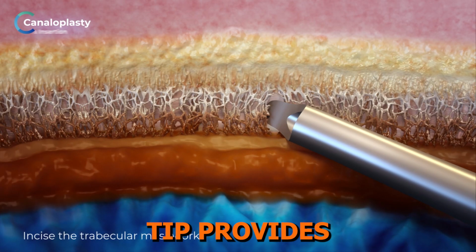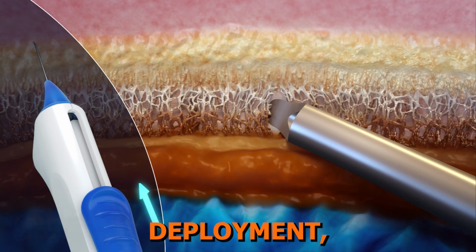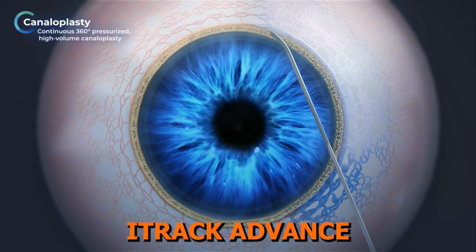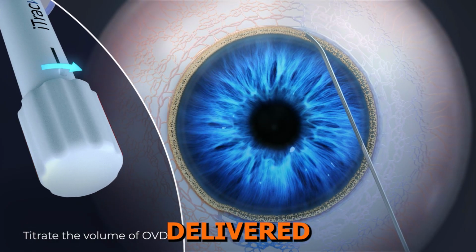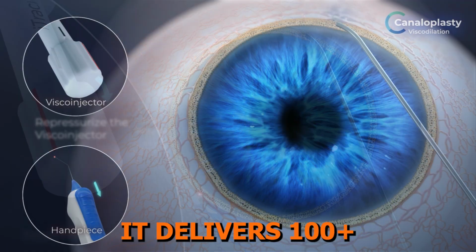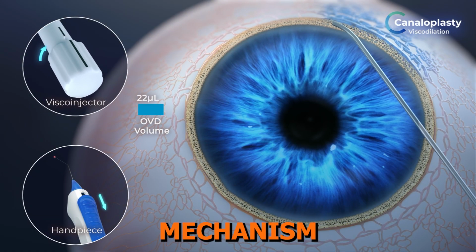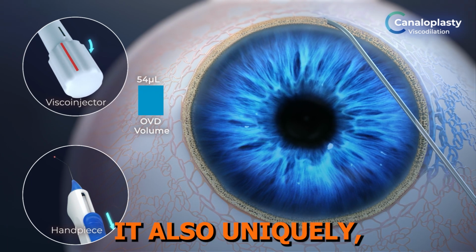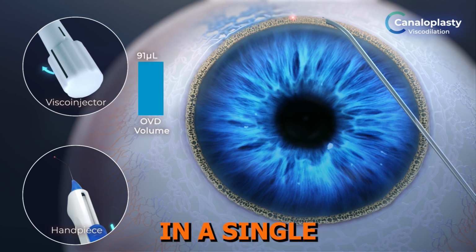The spatulated tip provides stability and precision, and the handheld injector simplifies deployment, eliminating the need for forceps to insert the catheter. iTrack Advance is the only device that can titrate the volume of viscoelastic delivered based on the patient pathology. It delivers 100 plus microliters of viscoelastic via a pressurized mechanism designed to overcome stenosis of the canal and collector channels. It also uniquely can catheterize 360 degrees of the canal in a single intubation.